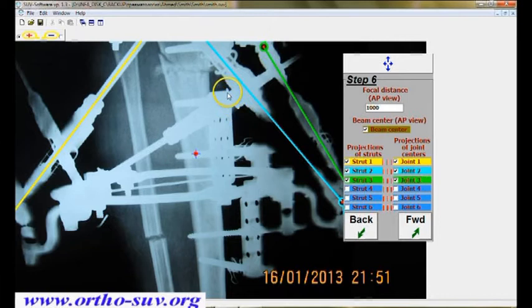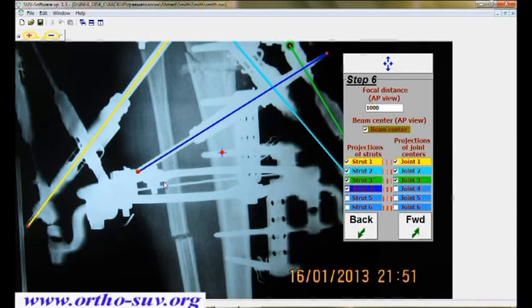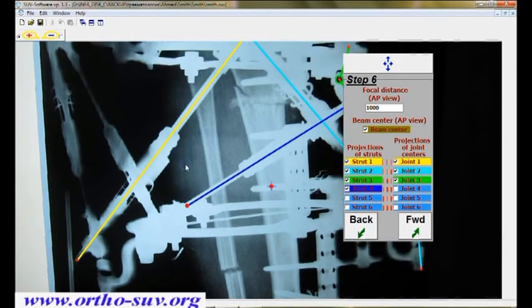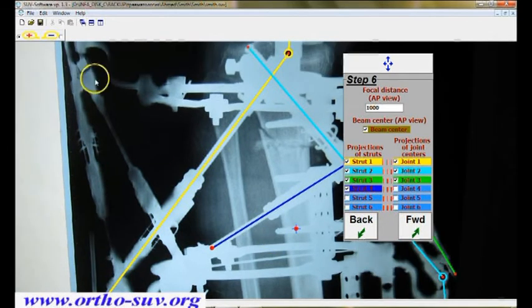Now you see strut number 4. The joint of strut number 4 is not seen and we cannot mark it, but we can show the software the strut number 4 itself. So we will mark the strut number 4 box as well as we did previously, and now we drag the line from down till up. You remember strut number 2, 4 and 6 from down till up, struts number 1, 3 and 5 from up to down. And we don't mark the joint of strut number 4. It's possible because it's not necessary to mark all the struts and all the joints.